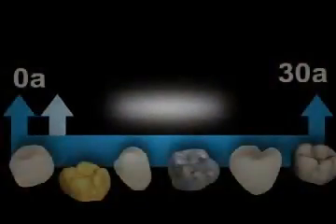The crown in the picture on the right has been made out of a prefabricated shell and has only been painted according to the color indicated by the dentist. The technician in this case never saw the patient. This is quick and costs less time and ultimately less money.